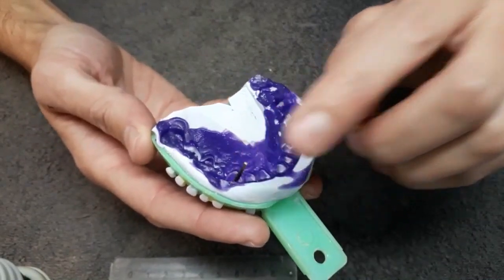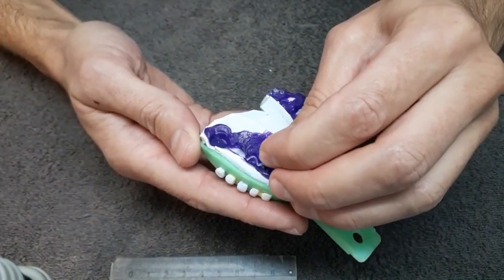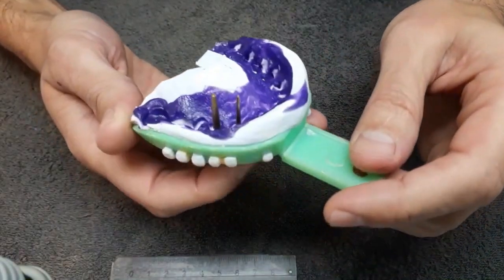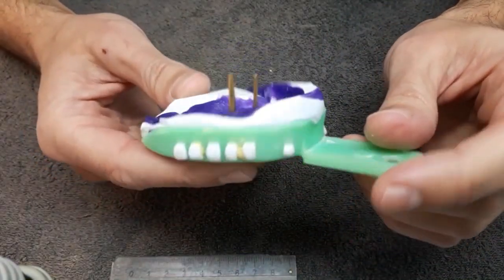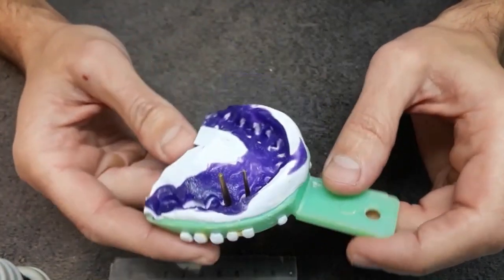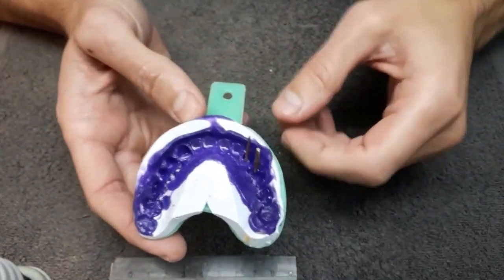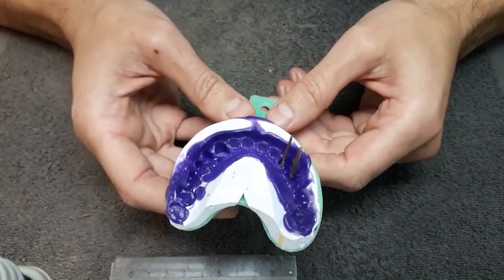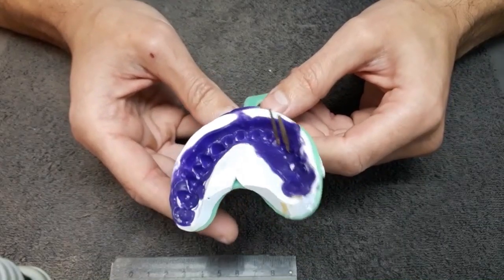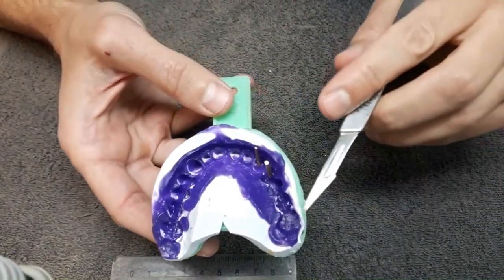Yes, abutment generally is the name of the tooth that has been trimmed or prepared, and die is the correspondent on the model, as you can see here. So we place the pins in the elements that will have to be removable. So now we will be able to cast the plaster up to the margin.